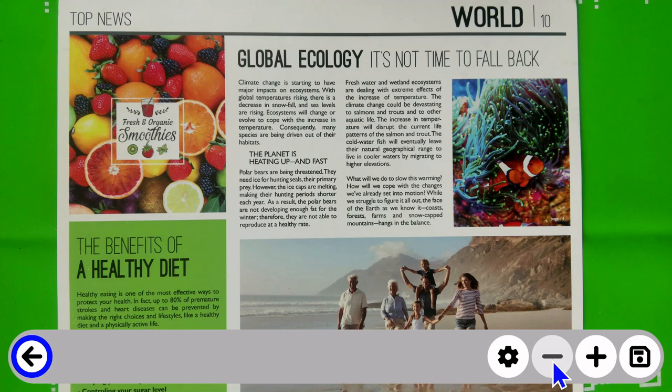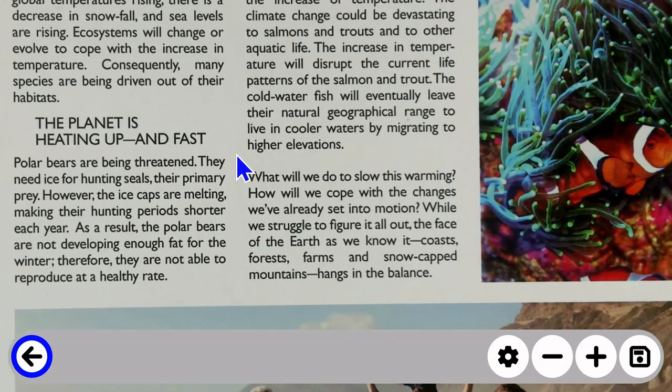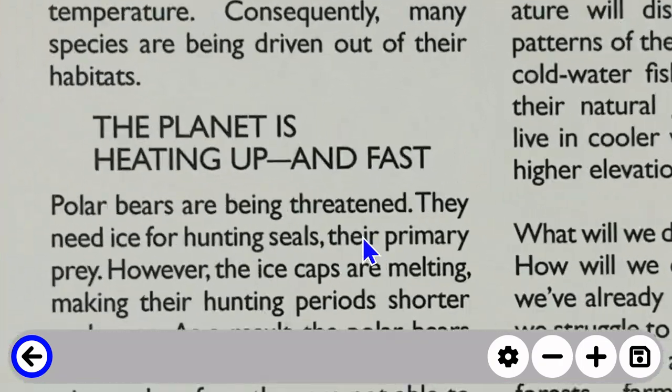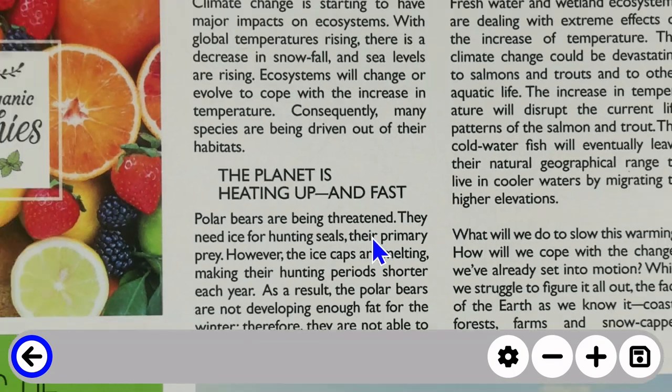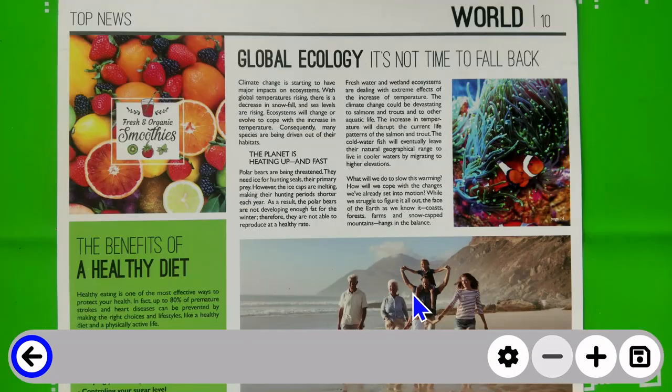And in this case, we've only captured an image. Notice we didn't get the yellow boxes with text around it because we did not do that optical character recognition. But I can now zoom in on this document and go all the way up to 80 times on here. And I'm using the wheel on my mouse right now to do my zoom in and zoom out.